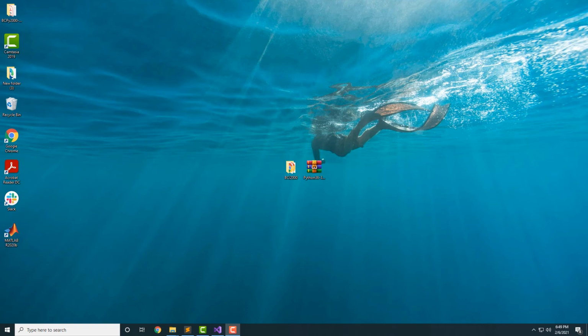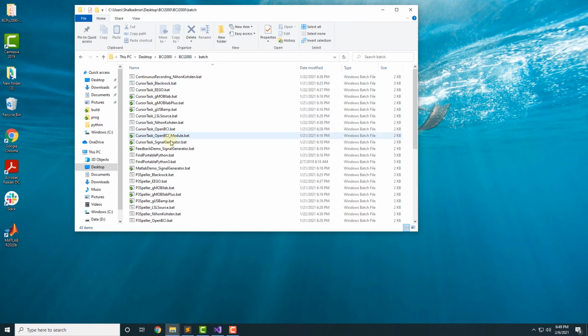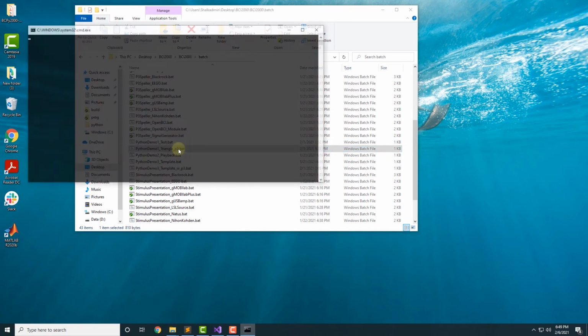All we have to do is open up the triangle application batch file, which is called Python Demo 1 Triangle P3.